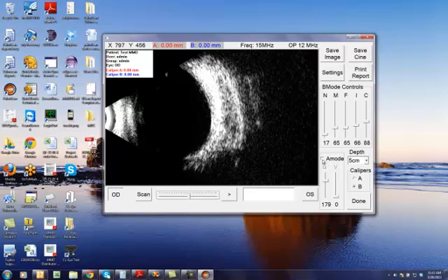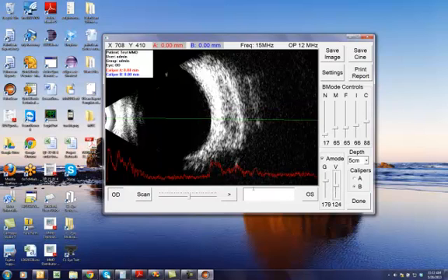If you wanted to see the A mode vector, you click on the A mode checkbox here. You will see a green vector selection tool that matches with the slider that's under the V slider. So that tells you which vector you're actually looking at. And the red graph here is the information within that vector that we're looking at. The G slider is the gain of the A mode vector. If you want to see it higher or lower, you can adjust it by adjusting the gain.